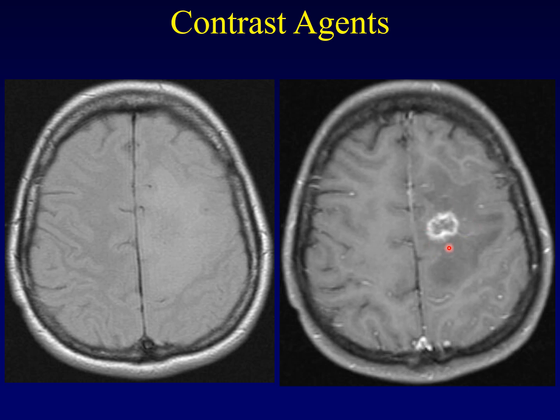This looks a lot like a tumor, much like the one on the CT of the previous slide, but this is not actually a tumor. This is radiation damage that occurred after someone had been treated for a vascular malformation. This is an iatrogenic injury.